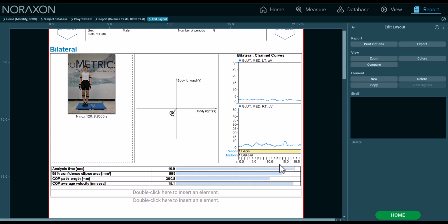So now I have something that is really comprehensive, but it does only exist for one activity. Anytime you are creating a multi-activity report, I oftentimes recommend getting everything you want for the first activity all ready and set to go, because it makes creating the rest of the report so fast. You could simply copy this and just change all the activity restrictions. So I'm going to go ahead and show you how to do that next.